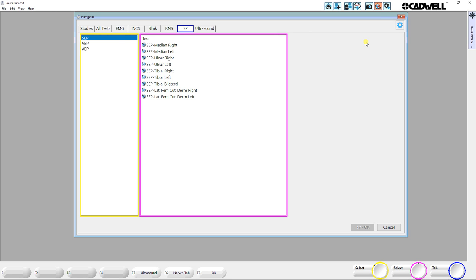This video will cover the basics of running SEP tests on the Sierra Summit version 3.1. To get into your SEP tests, you'll pick the EP tab or the All Tests tab in your navigator, and then select SEP, and you'll see all the different SEP options. Double click on the test you want.